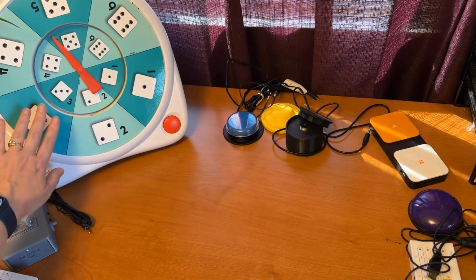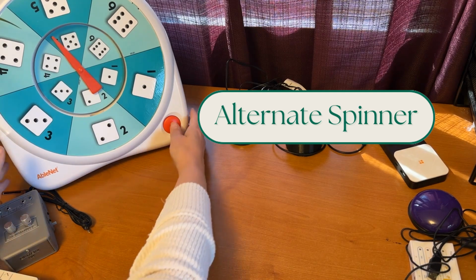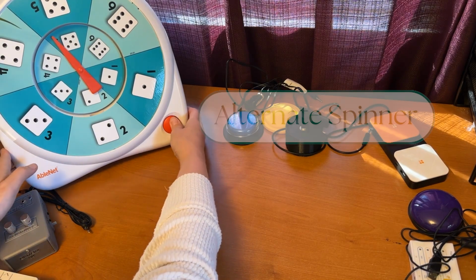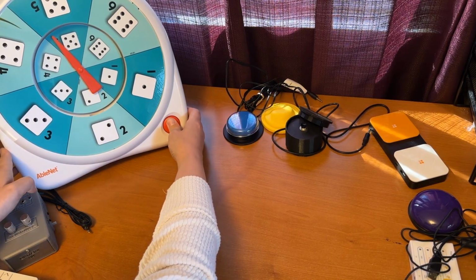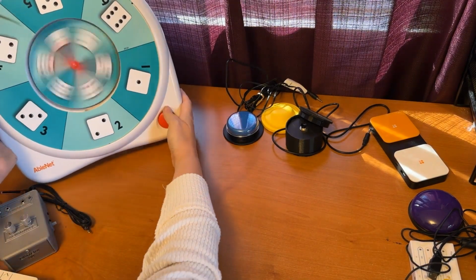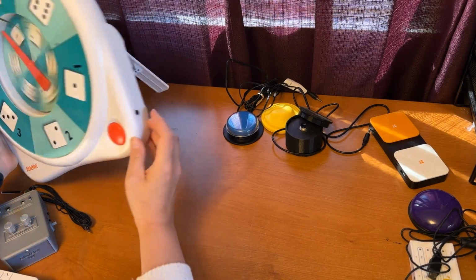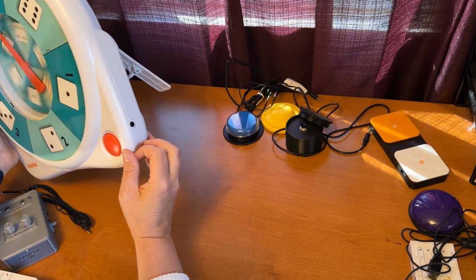Up here in the corner, I do have what is called an alternate spinner. What this does is, when the button is pushed, the spinner spins. Now I might not actually have batteries in it. Oh, there we go. It wasn't turned on all the way. So this is an example of a device that can be used by plugging a switch into it.